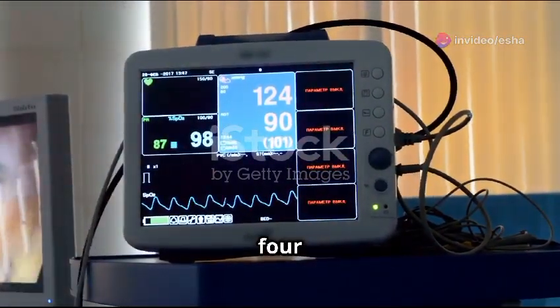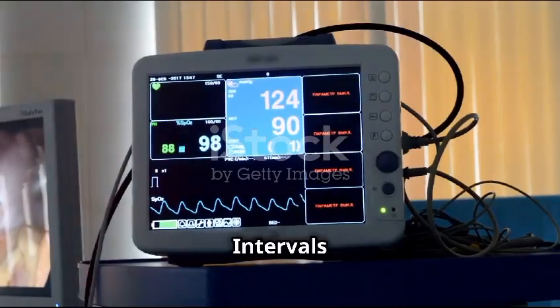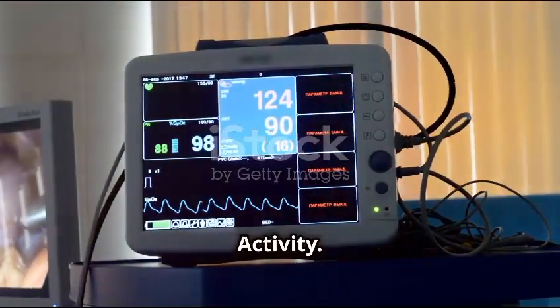Section 4. Electrical axis and intervals. Unveiling the heart's electrical activity.